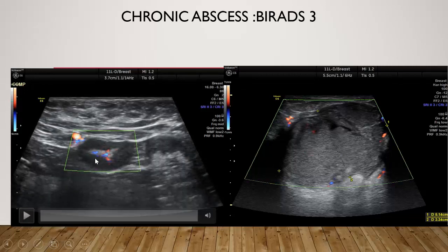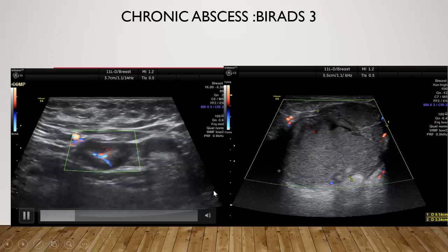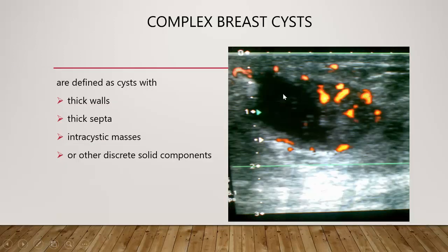And here again, this is not suspicious. The vessels are not coming from the hilum. Some will say that this is focal thickening. No, if you change the image and try to give the length of the lymph node, you will find it like that, diffuse thickening. Complex breast cyst, this is also a cystic lesion, but it shows a solid component with marked vascularity, malignant nature, lack of arborization. So this is very suspicious, not suspicious only. It is very suspicious, you can put it 4C.